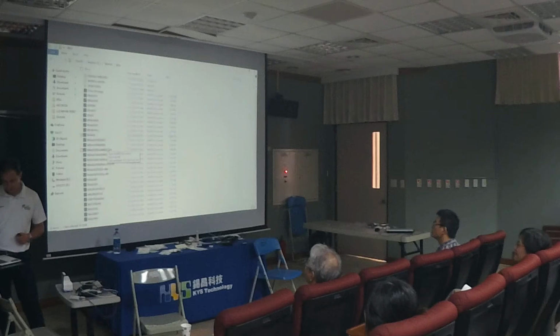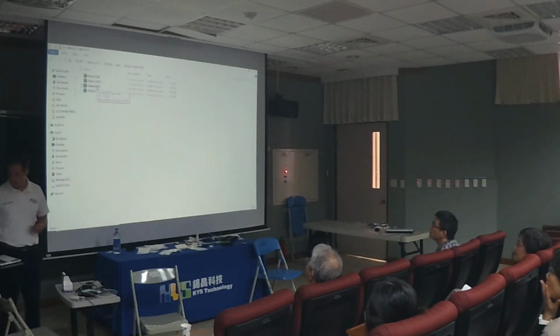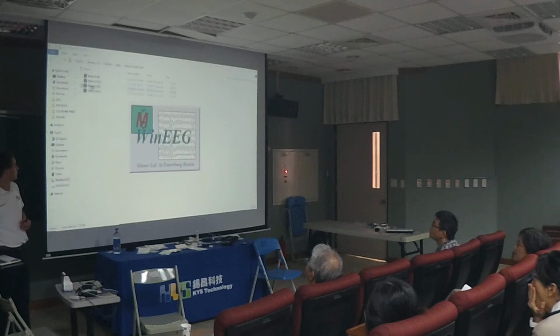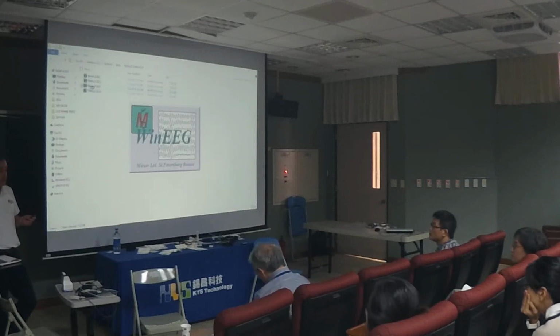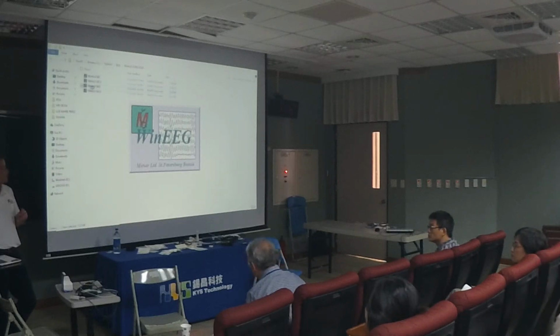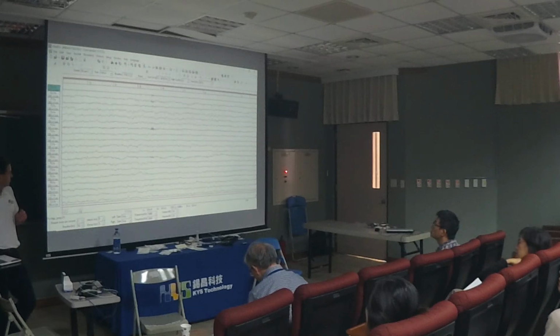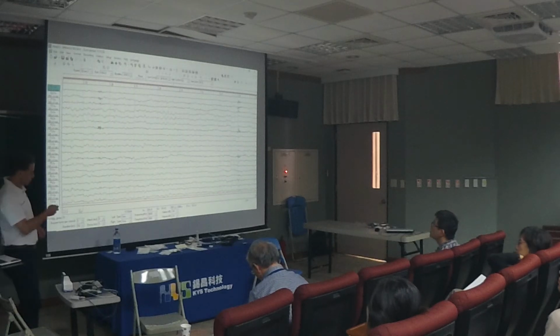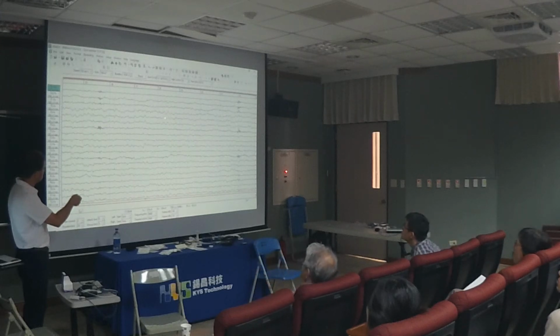So, I want to show you this. This is a case that I treated recently for a 13-year-old female who came with complaints of poor academic performance. This is the pre and the post map after 20 sessions. I want you to pay attention to the main activity, which is this one, FC, the frontal area, because that's where we did the training.